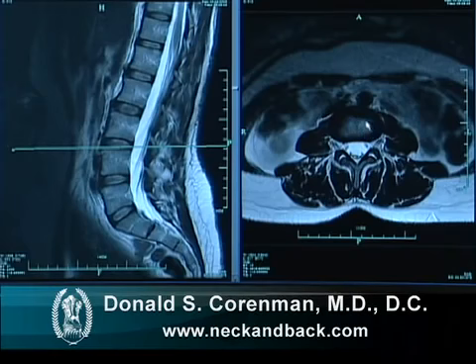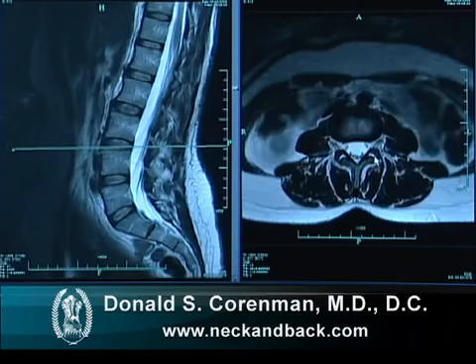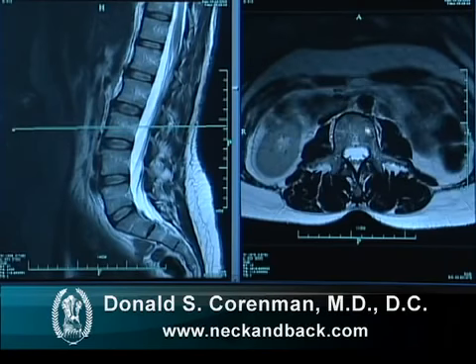We can march up then and go to the next level at 3-4 and again see the same thing: the jelly-filled donut, the outer plies of the tire, the sac of nerves. If we get a little higher, we can see the actual facet joints, and this is a normal level. We can continue to go up and see more. Here is the basivertebral vein and some of the veins within the vertebral body itself. So when you look at these images, these are normal.